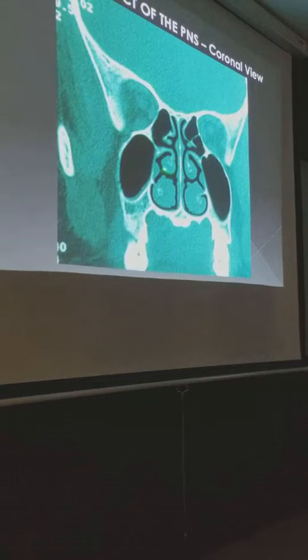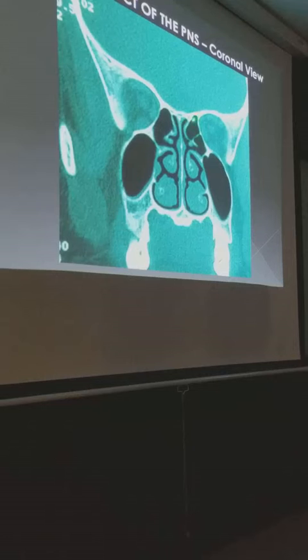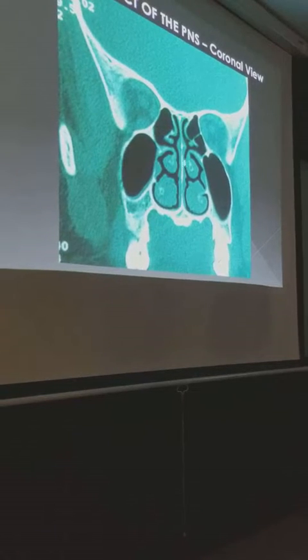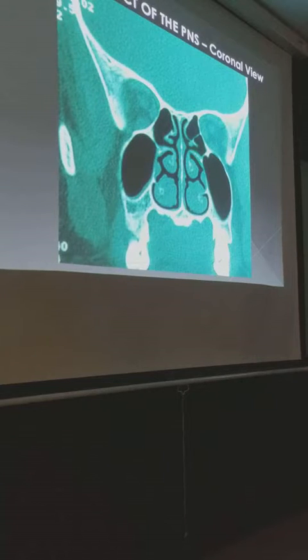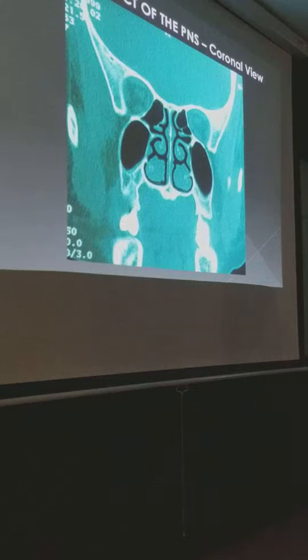Okay, so this is much clearer, right? Horizontal na talaga. This is your perpendicular plate. Skull base is there, and that is your superior turbinate together with your posterior ethmoid group of cells with your bony septum. Clear? So we're done with that, right? We've seen that. Alright, next. Same. It's really oriented. Almost no more uncinate. Okay, same. Next slide.